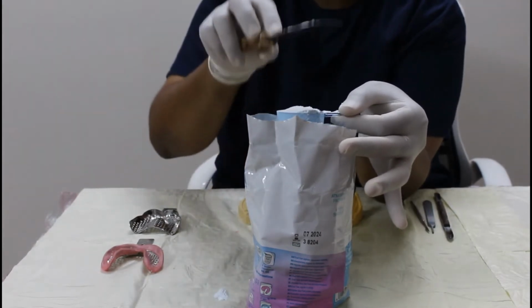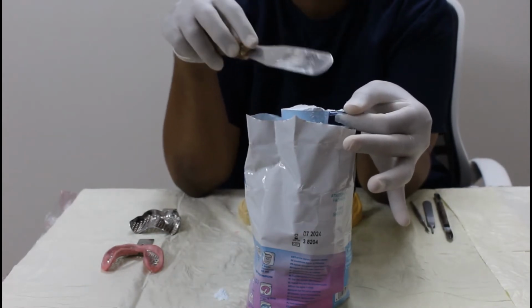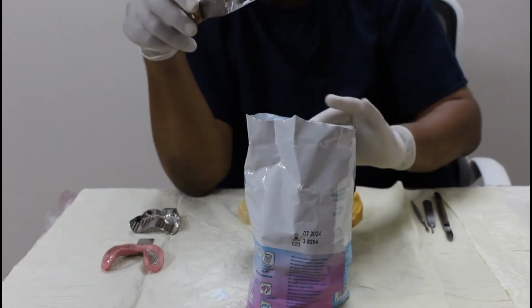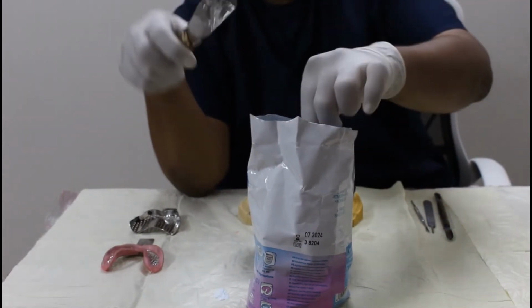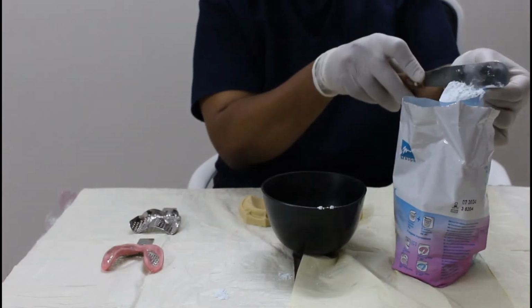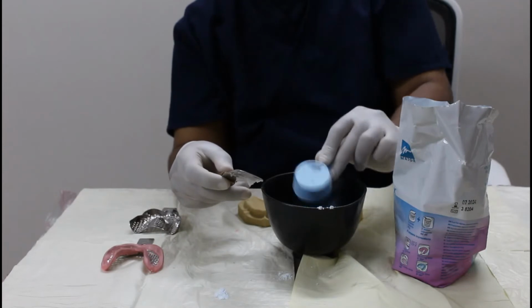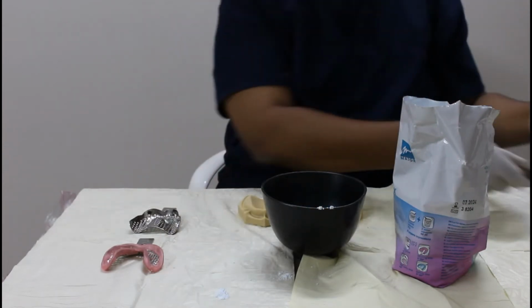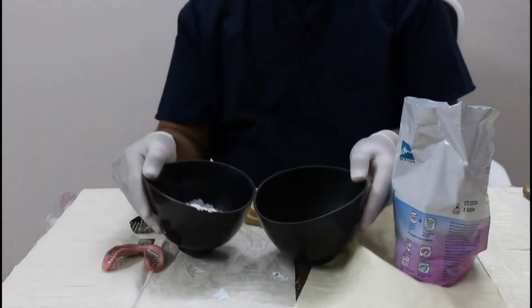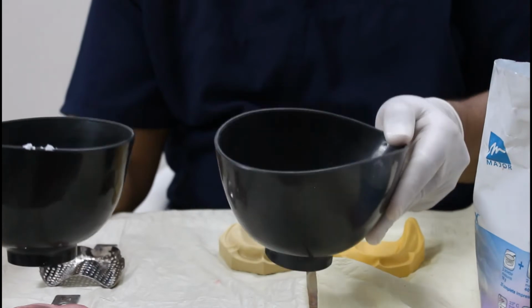Okay. Do not press the material. If you press the material, the material will get condensed, so you will take more powder. So take 1 bowl, another bowl. Just move the spatula like this. This is the correct level and take it. So now you have 2 bowls, 1 bowl with 2 scoops of water, the other bowl with 2 scoops of powder. It should be ready like this.